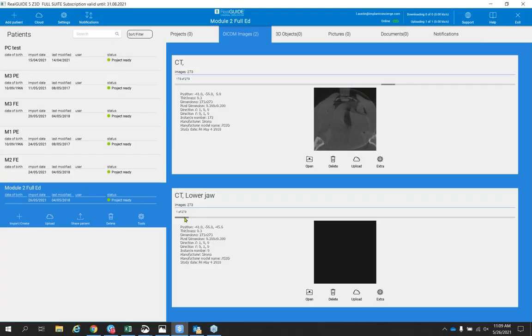The lower scan here is our denture scan, and slide on over, and you can see the denture scan here. Now, I get asked a lot, how do you position a denture, and does it matter? And it actually does. I've worked in offices where we've done these protocols, and for lower dentures, it's important to set the denture on a foam block or something that's radiolucent so that you're not picking up the plate of the scan machine that the denture is resting on, which could interfere with any registration.